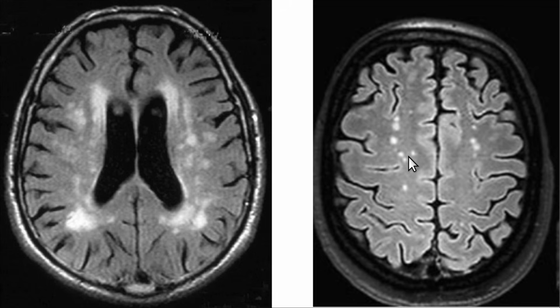The reason this terminology is useful for a neuroradiologist is you have to describe where abnormalities are located, so you need to know the vocabulary. But for somebody just watching this who wants the general idea, what you need to know is all the bright spots are strokes, okay? These are called silent strokes. On the macro for dictating a brain MRI, these are typically called periventricular FLAIR hyperintensities. They used to call them UBOs, unidentified bright spots, when MRI first came out in the early 1990s.